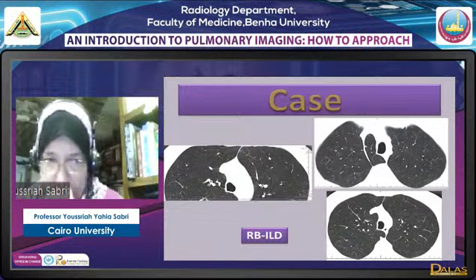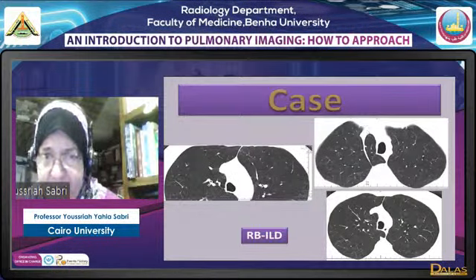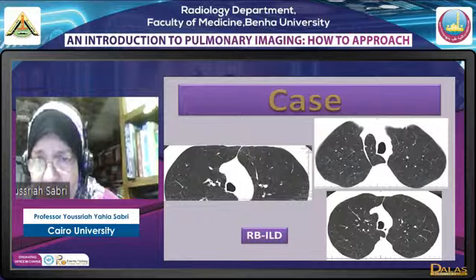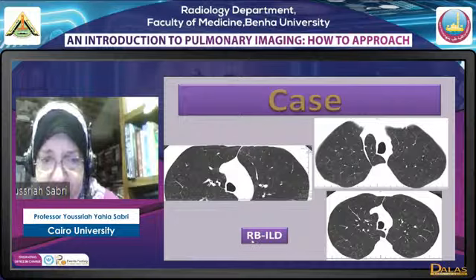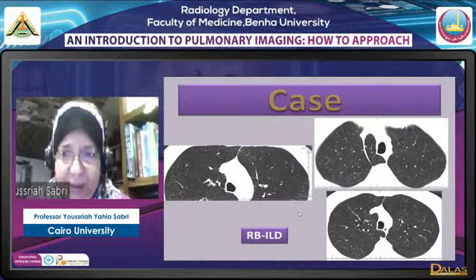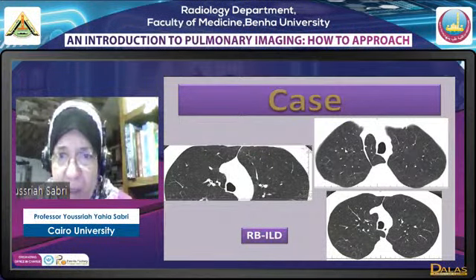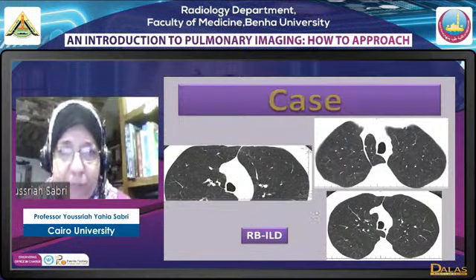This is a patient, a heavy smoker, with hyperlucent lung. As you can see, this is an azygous lobe fissure. Upper lobes show those faint, ill-defined ground glass centrilobular nodules, and this is classic for respiratory bronchiolitis interstitial lung disease, one of the interstitial lung diseases that are smoking related. Again, this is a pattern of centrilobular, faint, ground glass, ill-defined nodules in a heavy smoker.